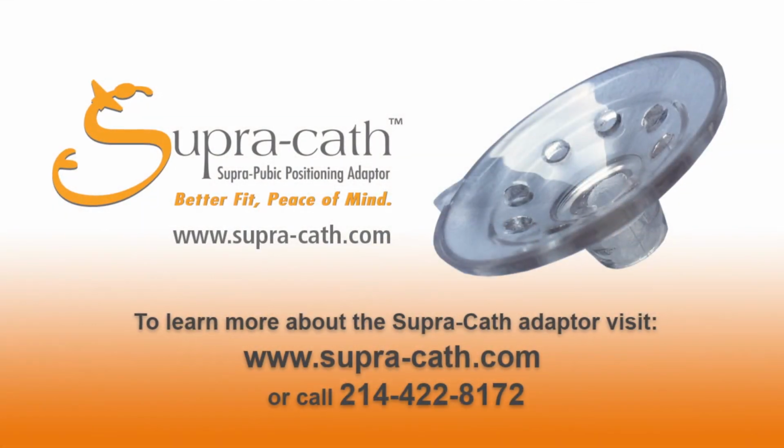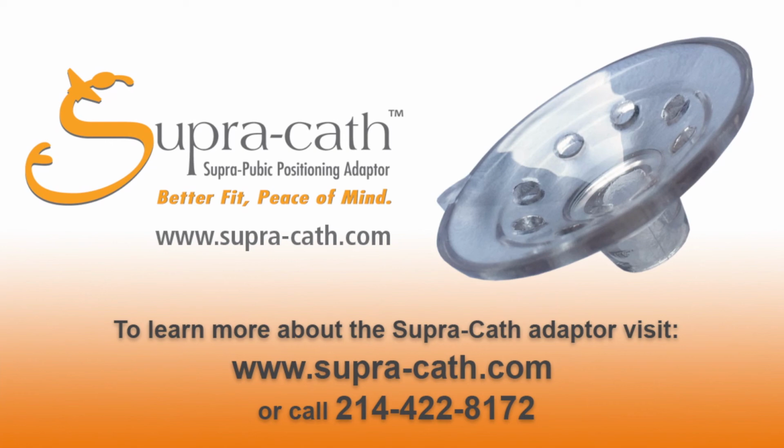The SupraCath suprapubic positioning adapter. Finally, the suprapubic solution.